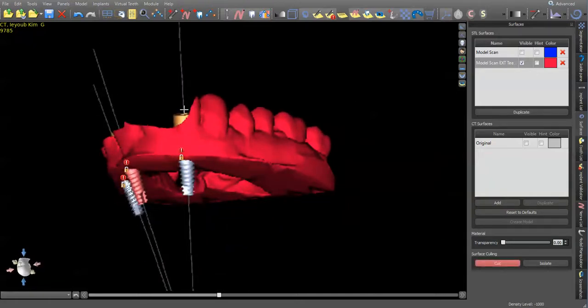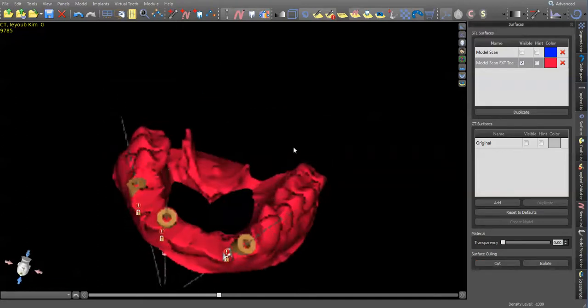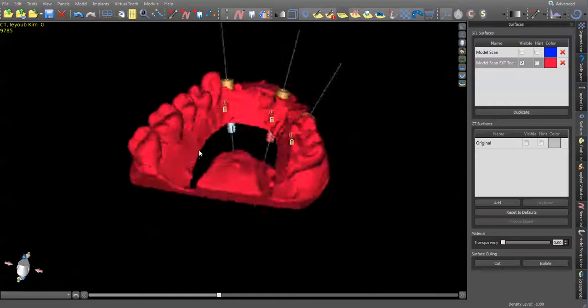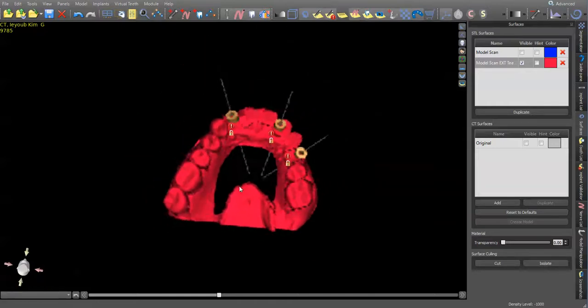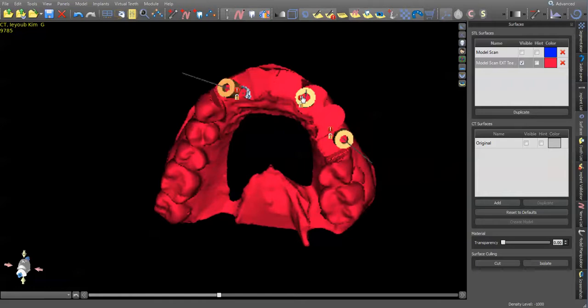I'm going to continue with this. Just tweaking it up. All right. So we'll do that later in Meshmixer. I'm not really pleased with this. I know what's going on with her because of soft tissue recession. So I'm very aware that, all right, you see how this is coming out a little bit mesially? I'm going to see if I can correct that.